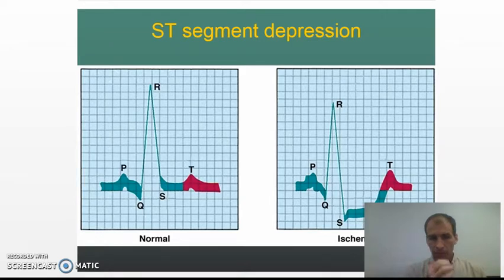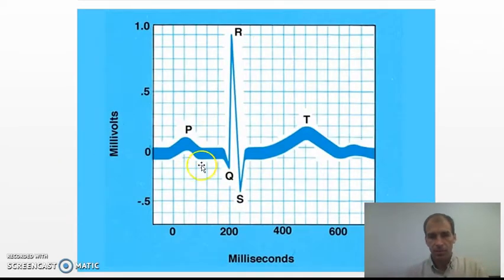So if you recall, this is our standard EKG strip right here. Remember P wave, QRS, and T wave. Atrial depolarization, ventricular depolarization, and the ventricular repolarization. And the beauty of this, it allows us to know not just what's going on with the conduction of the heart, but what's going on with contraction, again, because the two are related. So one thing we use the EKG for is to look at abnormalities in this to get a sense of what may be going wrong with the heart.